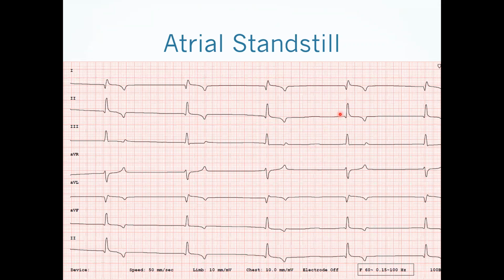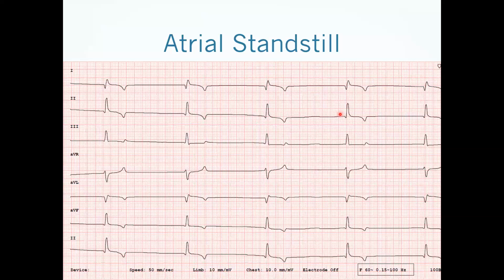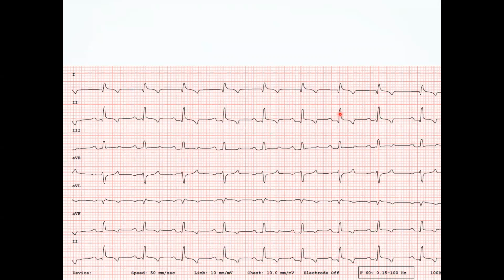Yeah, so hyperkalemia. That's the classic presentation that you're going to see with atrial standstill in the ER setting. This is the very same case as here. When the dog presented, he actually had Addison's, and he was hyperkalemic at, I believe, 7.8. Once we started to correct his hyperkalemia, we saw P waves come back. Our QRS complexes look the same, but now our P waves are back.